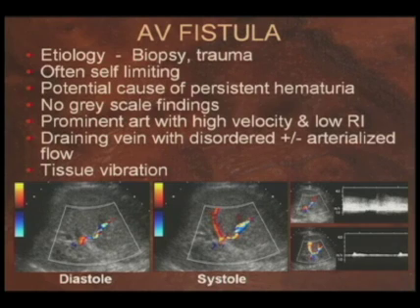So on this image obtained in diastole, you see one vessel heading into the lower pole and no vessels anyplace else. That's because there was some underlying renal parenchymal disease in this transplant kidney. In systole, you continue to see that one prominent artery heading to the lower pole. Now you see another artery heading to the mid-pole here, but look at the difference in color saturation. You can tell that that artery that's heading to the lower pole has a lot more blood flow in it, and that's confirmed when you do Doppler analysis to the artery that's supplying the fistula, gangbusters arterial flow and a lot of diastolic flow compared to the artery going to the rest of the renal cortex, which has much less flow.